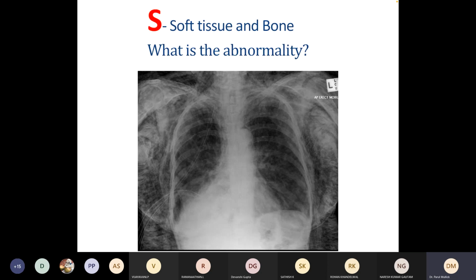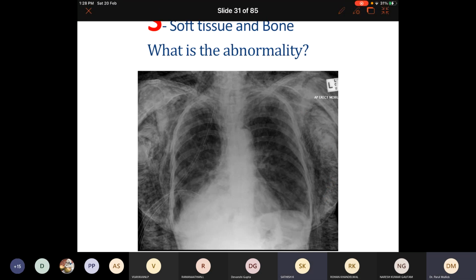Now, who is going to answer me this? What is the soft tissue abnormality that you are seeing here? What is the abnormality? कोई बोलो. ये बहुत difficult है क्या? तो spot है. This is a spot test. Ma'am, my patient is obese. ये obese नहीं है. ये क्या है? ये सारा कुछ घिच घिच घिच घिच. ये spot diagnosis है.